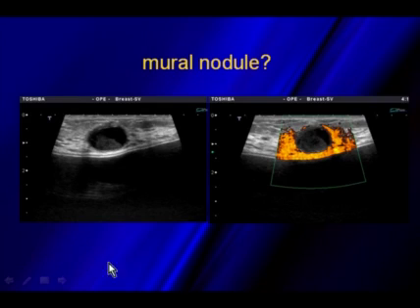One thing that you can do if you think that it might be just a fluid debris level is go in and use fremitus, and I'll show you examples of this in the later portion of this lecture where we talk about color Doppler, and I'll explain how fremitus is done. But if this lesion attaches to the wall of the cyst, then when the patient hums, you will notice that the lesion would also fill in with power Doppler.